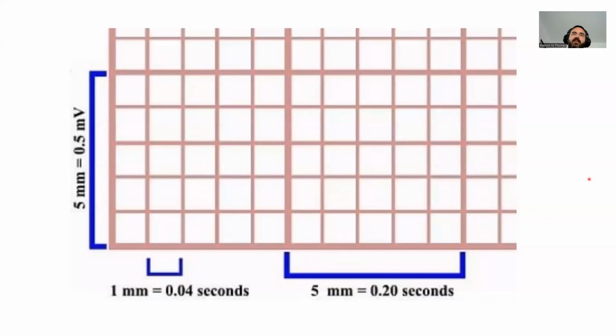We get to take the paper and squint our eyes and look really carefully, and try to figure out, oh, is that actually in this square? Is it actually starting in this square? And drive ourselves crazy trying to figure that out, when it probably doesn't matter either way. The rhythm is what it is, regardless of where you start measuring it.